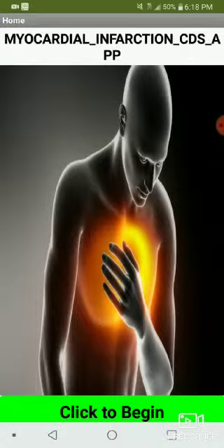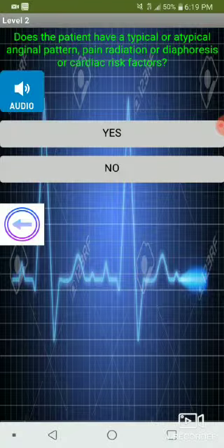start the application. So now a patient will present himself to a clinic or to a hospital, or even a patient could be using that app to see whenever they have some complication in the heart. So first, you have to enter the app. You click to begin. So let's begin. So now as a patient, you have pain. You have a heart pain.